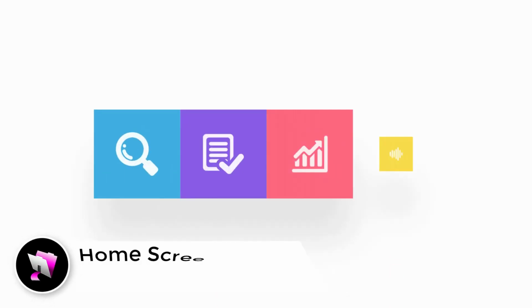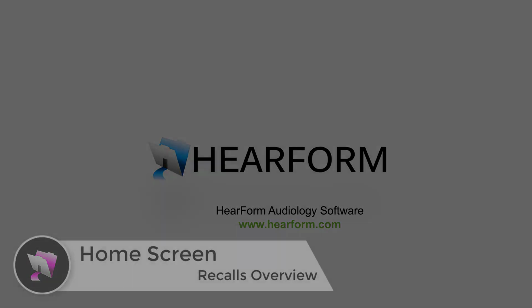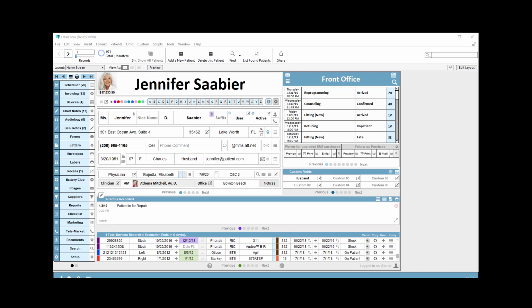Welcome back. This video will provide an overview of the Recalls module in HearForm Pro. The Recall feature in HearForm Pro is often called a reminder or a tickler file. We call it the Recalls area here, and if you click this button right here, which we'll cover in another video, it'll take you to a table where you can view a lot of your recalls as a list.